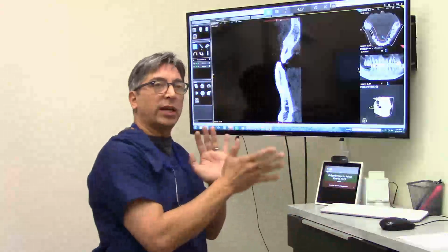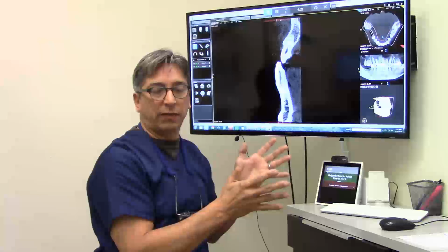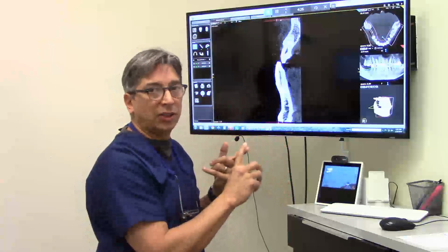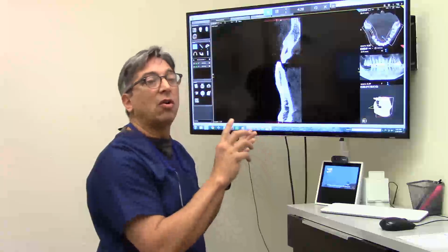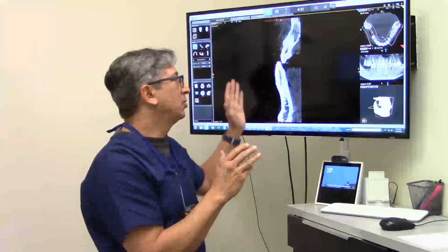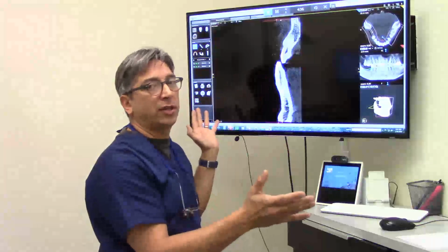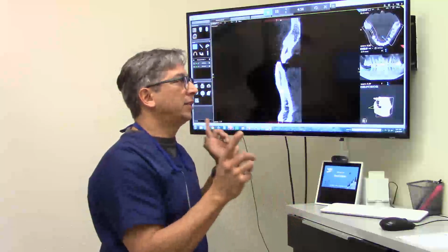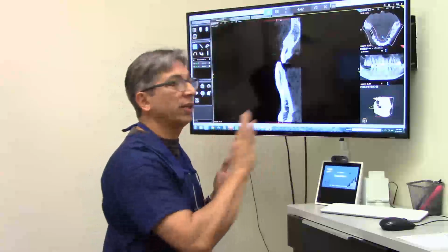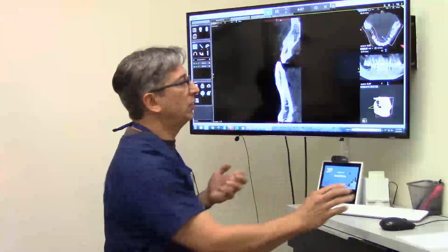So I'm always looking at what is the general trend of this particular patient. If there are greens everywhere else, they've got that one side, unless there's an infection or a defect or a fracture or some reason why biologically it's different. There's no reason biologically that this tooth is all that different than all the other teeth. The only case I would give it for is for orthodontics, when they really move the teeth out of the arch.